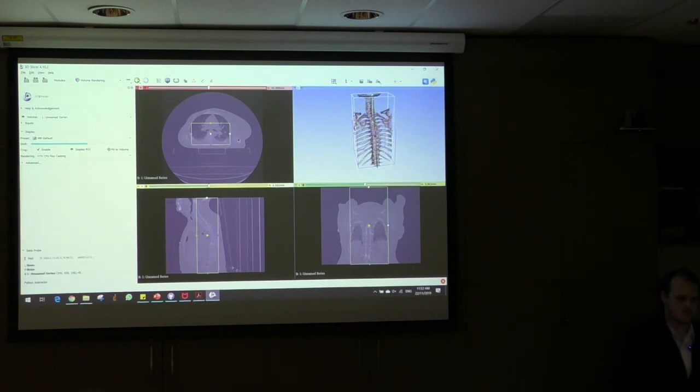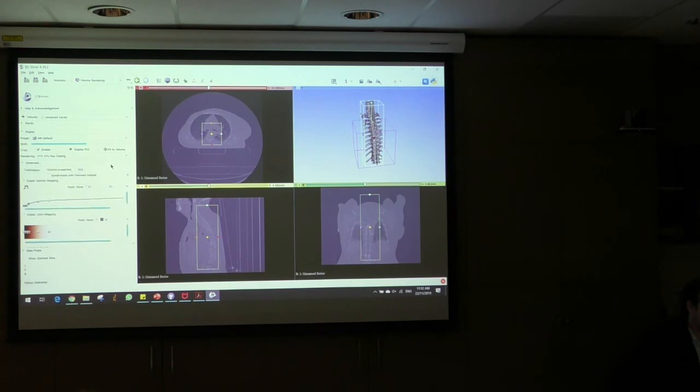So we can take all of this away. We'll focus really on the spinal cord at this point. Give me 2 seconds. Get it nice and perfect. Yep, all right.